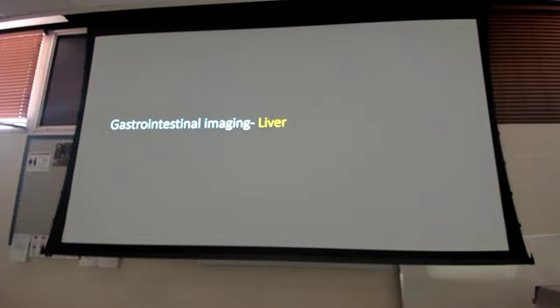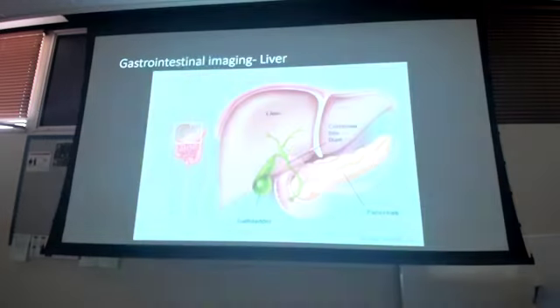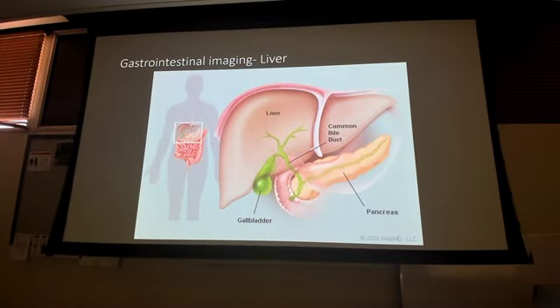That's it for the spleen. Know how to signify whether or not it's large, know where it's at, right? Liver, there it is.